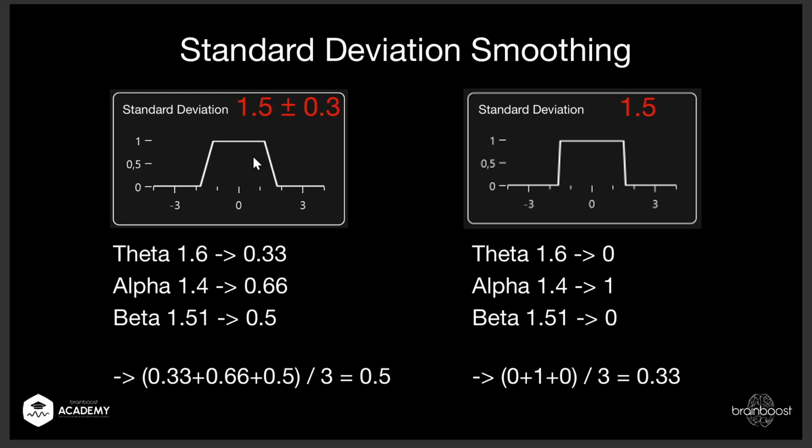So it's not super close. This is where I can, of course, decide this should be 0.1, so I'm a little bit more strict. But here, this is a good example, a bit of 1.51. I know, yes, it's just barely outside, but it's outside.